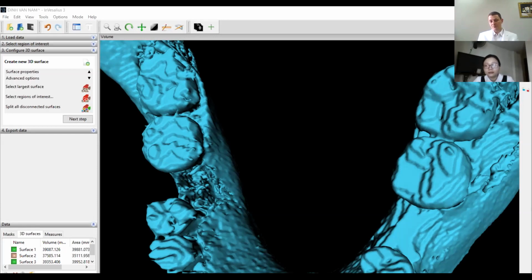Thì bài học hôm nay coi như là xong rồi ha. Nếu mình muốn luyện tập thì mình có thêm một file nữa, file khó, khi những răng hàm trên hàm dưới chạm nhau. Để làm file khó đó, mình sẽ phải loại bỏ những phần răng hàm trên chạm với hàm dưới để luyện tập.